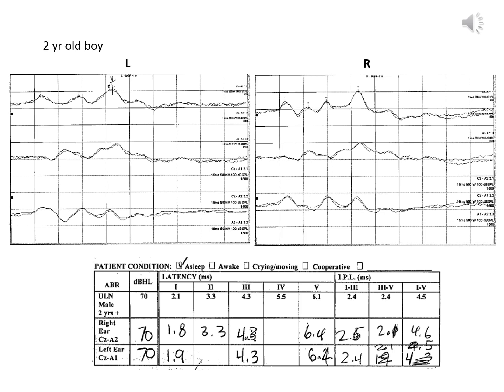This is a brainstem auditory evoked potential in a 2-year-old boy. We see a left ear recording and a right ear recording, both of them conducted at 70 dB. For both ears, we notice very beautiful, technically beautiful recordings. They're clean, they're reproducible, the peaks are identifiable. And so in the left ear, we see a very nice peak 1, 3, and 5. And in the right ear, we see a very nice peak 1, 2, 3, and 5.